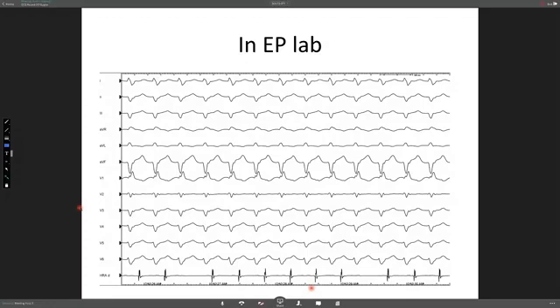So sometimes if you have a patient like this, I would go back to the telemetry and look more and more, and try to screen certain leads where you just look at the T wave, ignore the QRS complex, just look at the T wave from the beginning till the end to see if there are any specific differences, and that may give you a hint about the morphology.